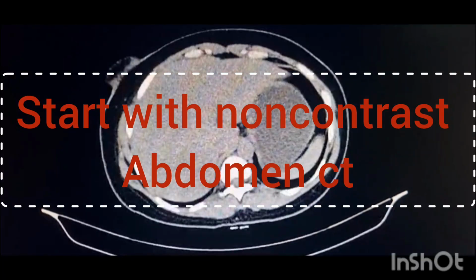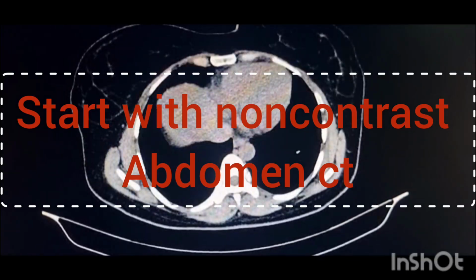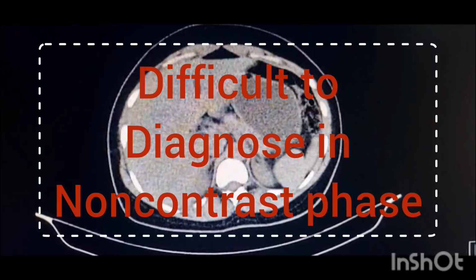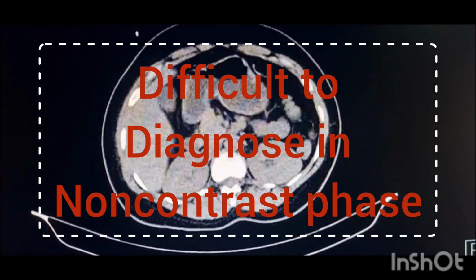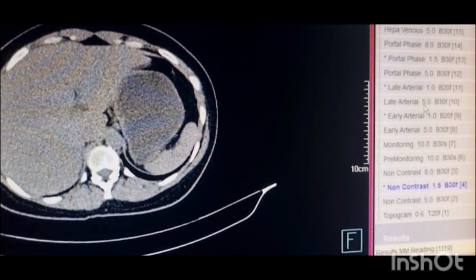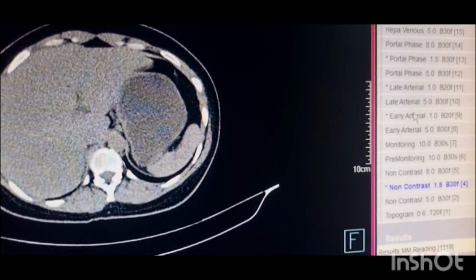In non-contrast phase, we see a rounded, homogeneous, slightly hypoattenuating lesion relative to liver parenchyma in segment 6. Sometimes it's difficult to diagnose hepatic hemangioma in non-contrast phase due to its very similar attenuation with liver parenchyma.